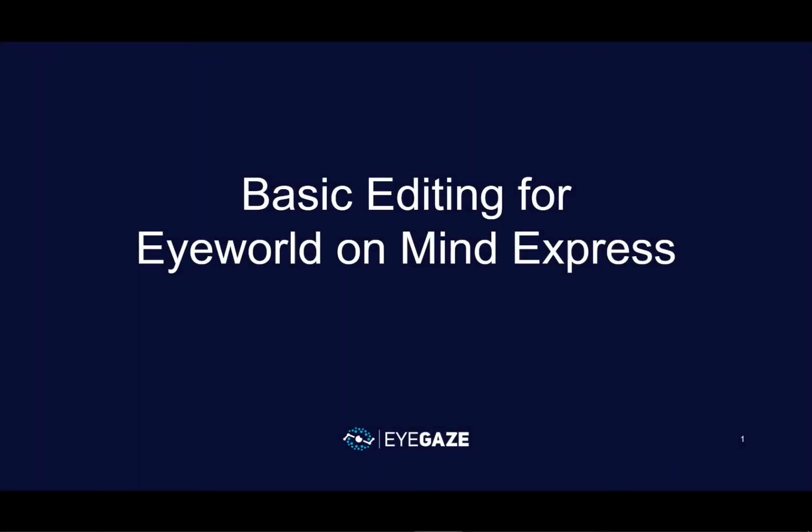I'm going to take a look at some of the most common Eyeworld edits we make during an installation or training. First, we'll look at how to go into edit mode in MindExpress. Then we'll see how to move a button, either dragging a button to a different place on a page or moving a button to a different page.